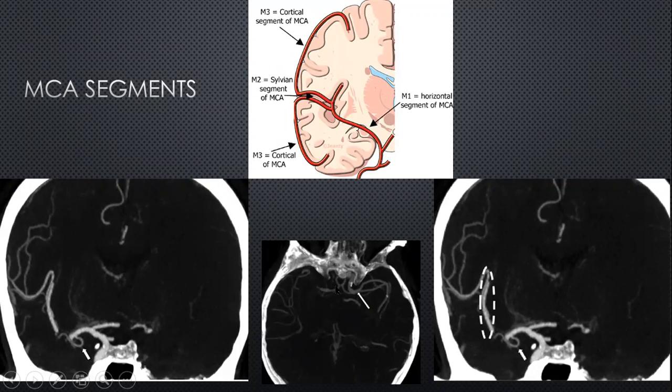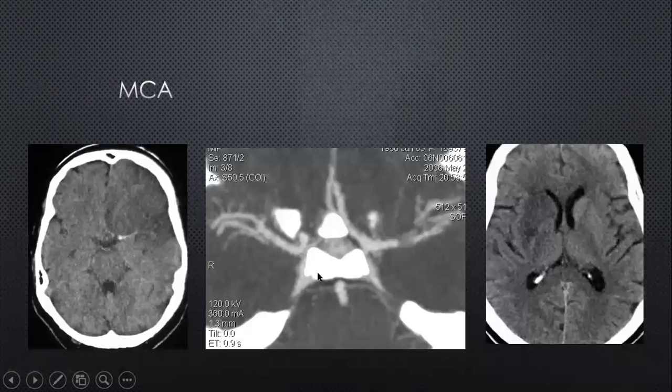And this is a patient who has had a stroke, and you can see the occlusion of the artery, but in spite of that, there is perfusion beyond that artery, suggesting that the collateral circulation is quite reasonable in this person. And again, just to identify the MCA within the proximal Sylvian segment with the hyperdense appearance over here, with the clot within that artery itself.